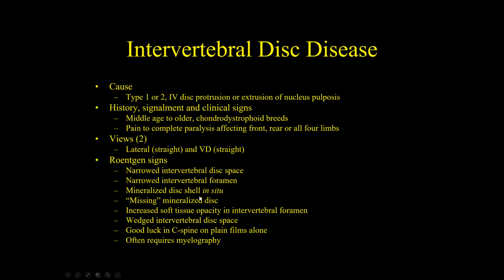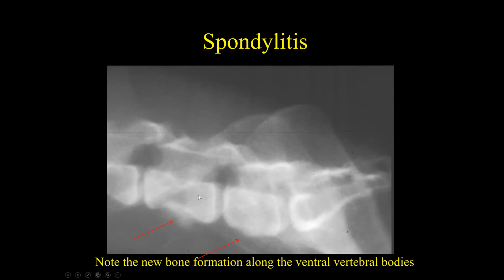So we talked about 3 different terms now. Just to review real quickly, and you need to know these, okay? Spondylosis, otherwise known by its full name, spondylosis deformans, is the bridging bony buildup of bone between 2 vertebral bodies, no lysis, just bony production. Totally incidental, can happen in the great majority of dogs, even when they're young, and it doesn't cause back pain. It's totally incidental, okay? But it can look really impressive.